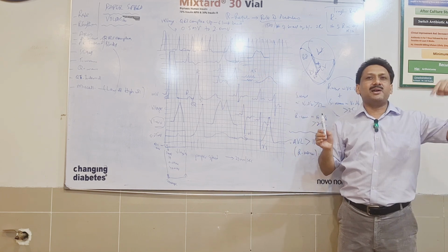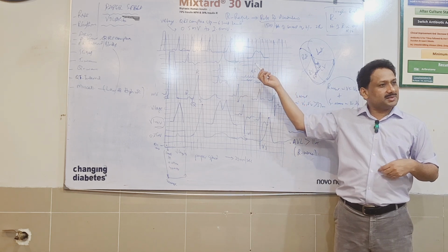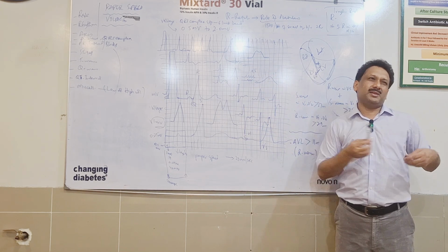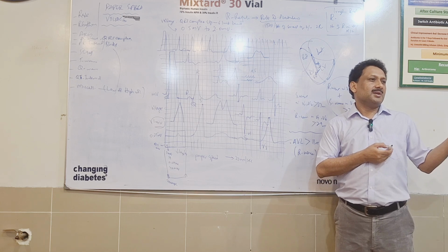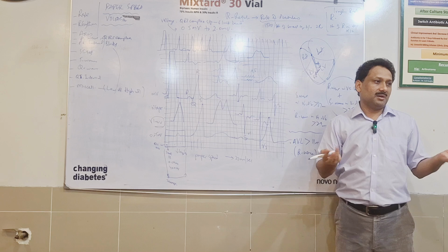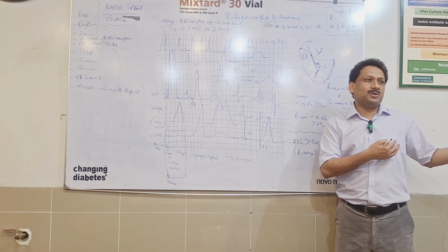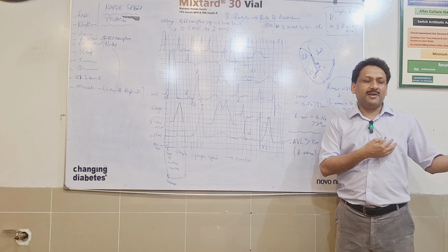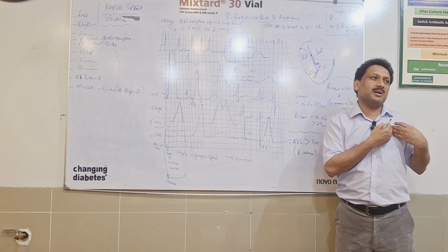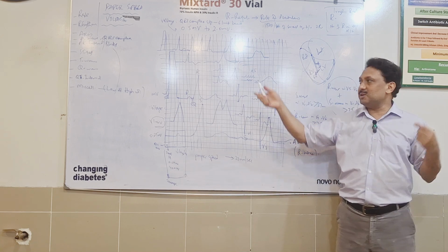In the setting of mitral stenosis, what will happen? We would be having a person with this kind of ECG. After seeing this ECG, would be saying that this patient is having mitral stenosis. The stenosis has led to left atrial hypertrophy because there is a stenosis in the mitral valve. Now the blood cannot go well to the left ventricle. And if it is not going well to the left ventricle, the pressure will be on the left atria. This will get enlarged.